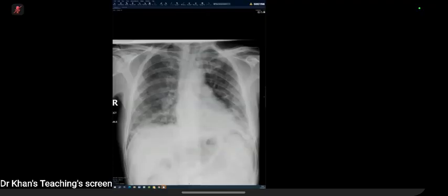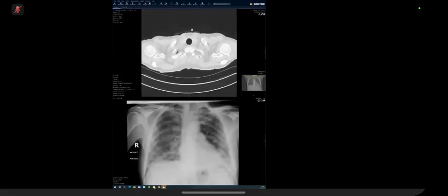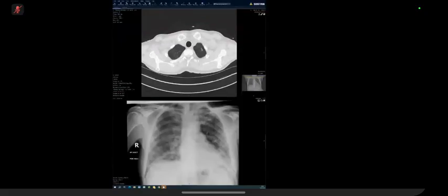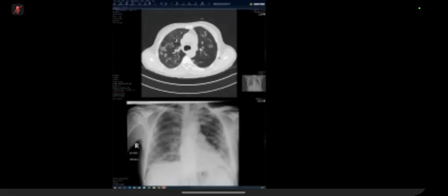Okay. So the patient is well, they only have a cough. What kind of pneumonia do they have? If the patient doesn't have fever, then it doesn't go well with pneumonia, as pneumonia causes constitutional symptoms. What other kind of process could cause this appearance without giving the patient a fever? Wegener granulomatosis may be one of the causes.